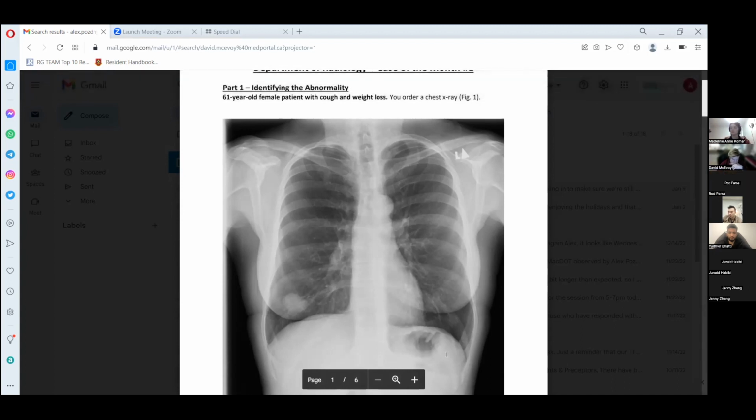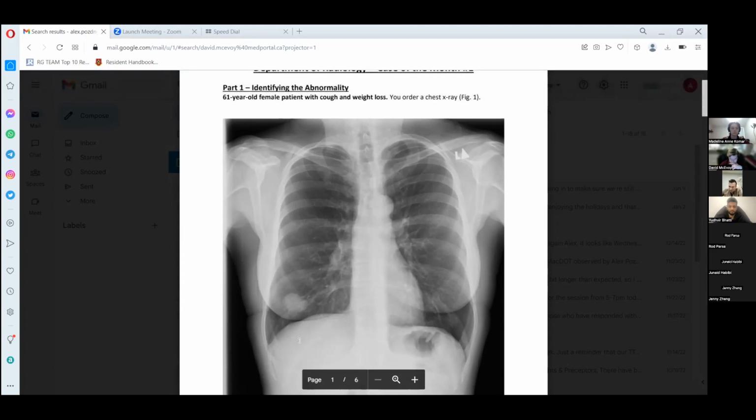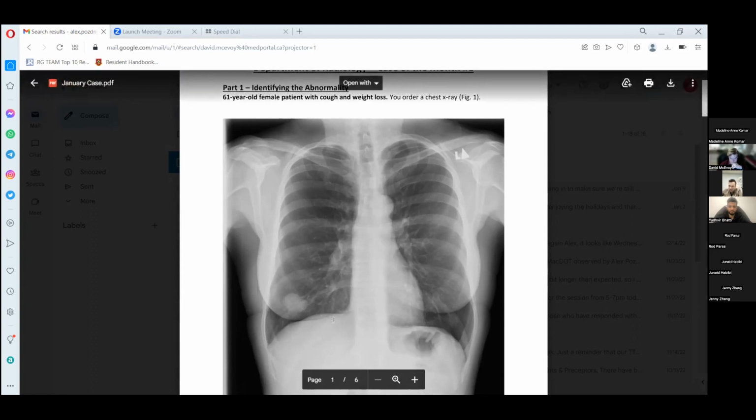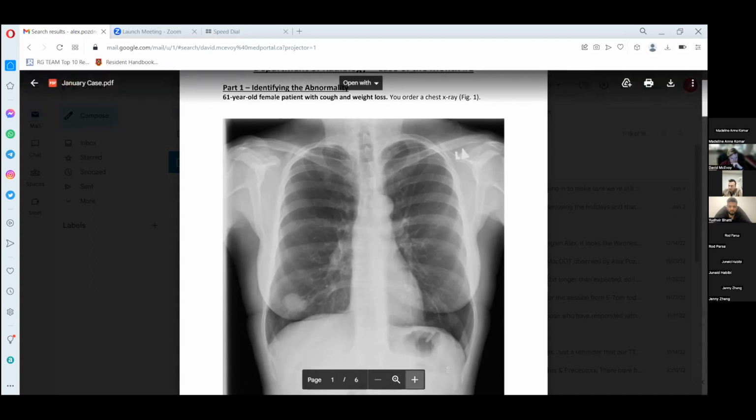And finally, last but not least is the abdomen. The abdomen is important because on the chest radiograph, we can actually see the pneumoperitoneum. We can see a faint black line that will outline the hemidiaphragm, especially on the right side. It's going to be very well seen because it's going to be against the liver.